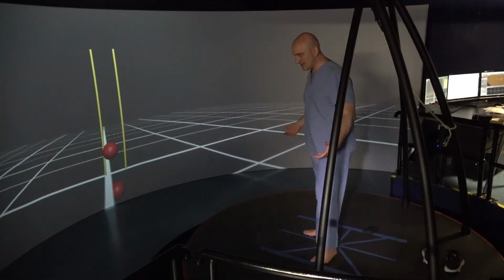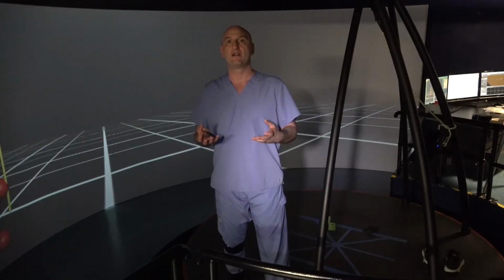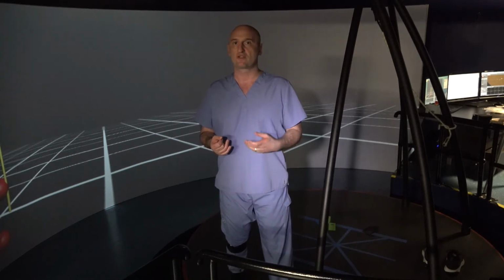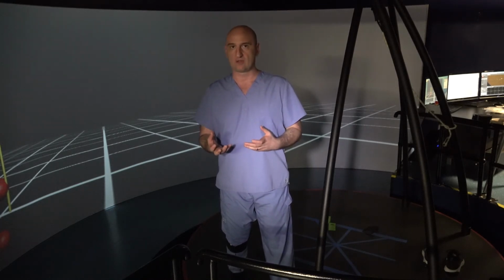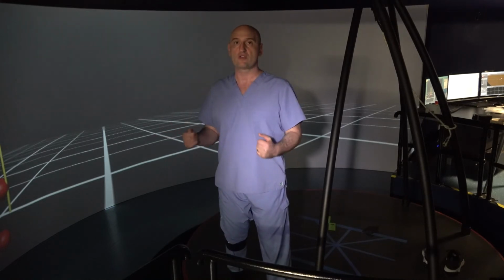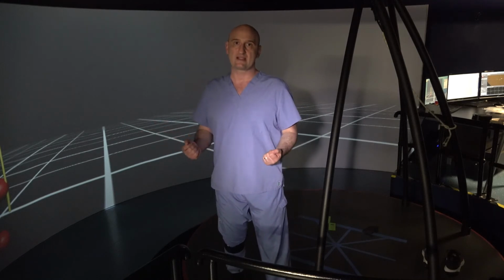Also to say that neither patients nor therapists have perfect vision to see what the patient is doing. Yes, we do visual gait analysis, and we think we know what we're doing, but that's not totally true, because when you experiment with this, you know that what you thought is not exactly the same. And then I'll show you how it does feedback.